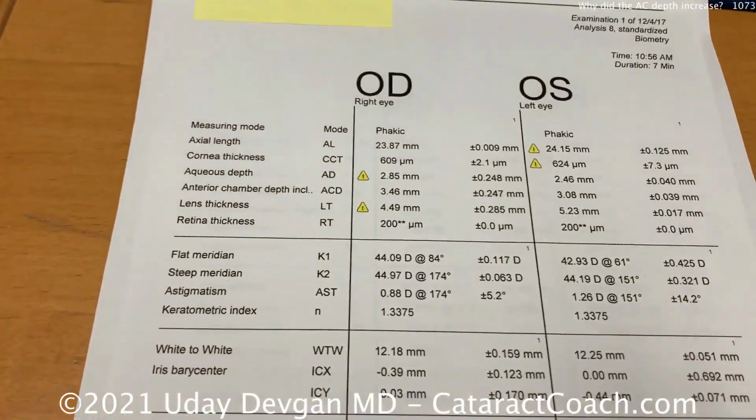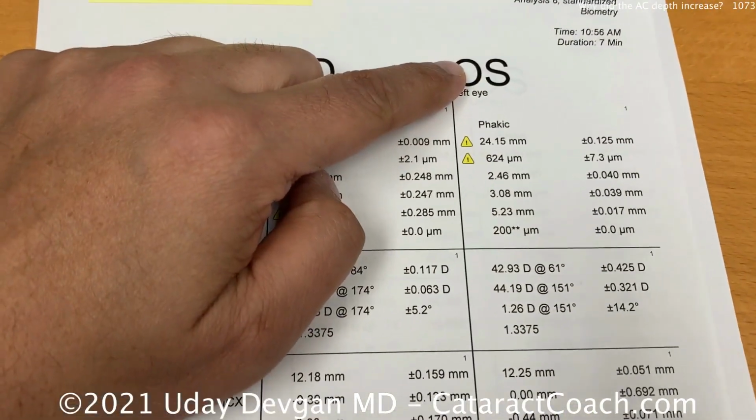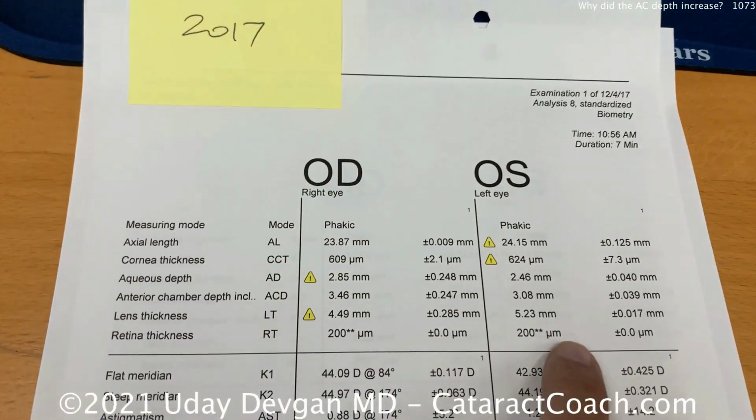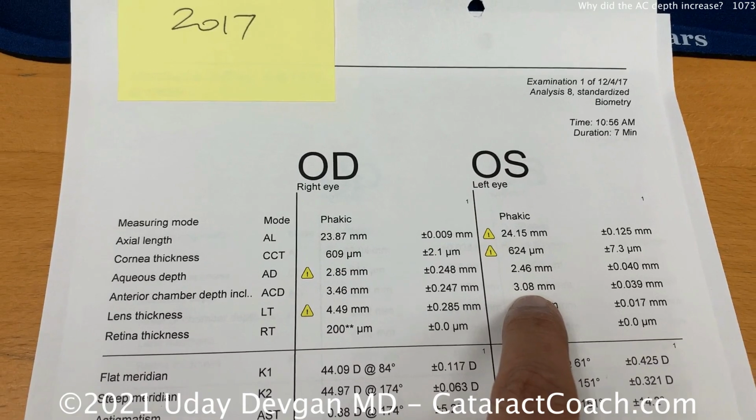Let me teach you. It's a great teaching point. It's something we've covered before. So here's the teaching point. Now we're looking at some lens calculations for a patient. We're considering the left eye cataract surgery. And we see in the biometry from 2017, the anterior chamber depth is 3.08 millimeters.